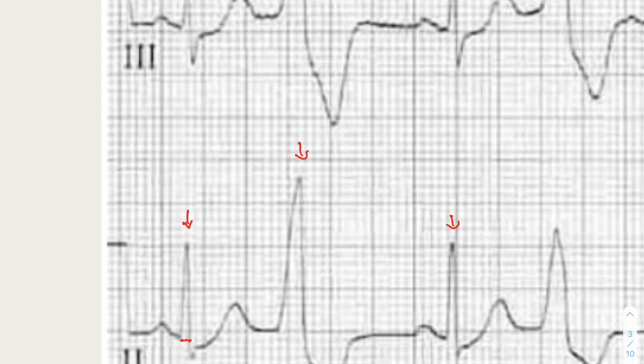This is a wide complex QRS interval there. And like we said, there's no P wave before it. You can count here that there's 1, 2, 3, at least 4 boxes there. So that would be larger than our desired 120 millisecond window for our QRS duration. So you do have some normal QRSs here, but you also have wide complex QRS morphology as well.